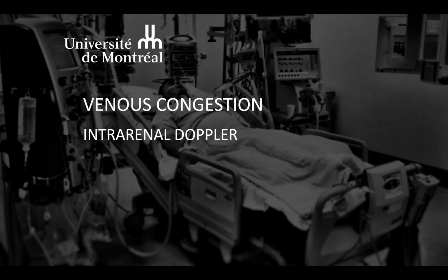This is part of a series of video tutorials and reviews about venous congestion. This video will focus on the cardiac physiology and the intrarenal Doppler assessment. The 3 other videos of this series will deal with portal vein Doppler, hepatic vein Doppler, and integration of all venous congestion profiles.